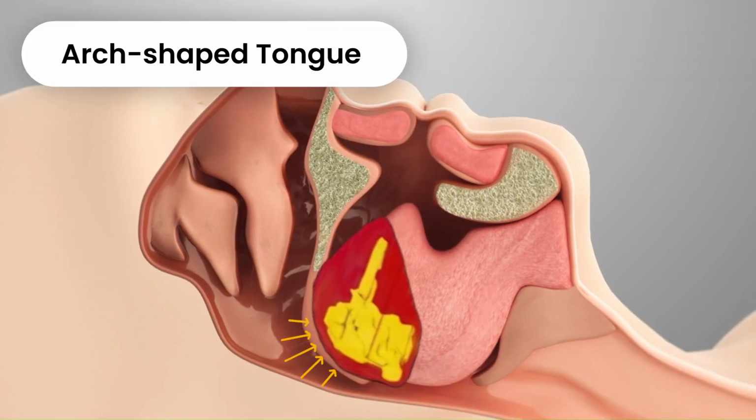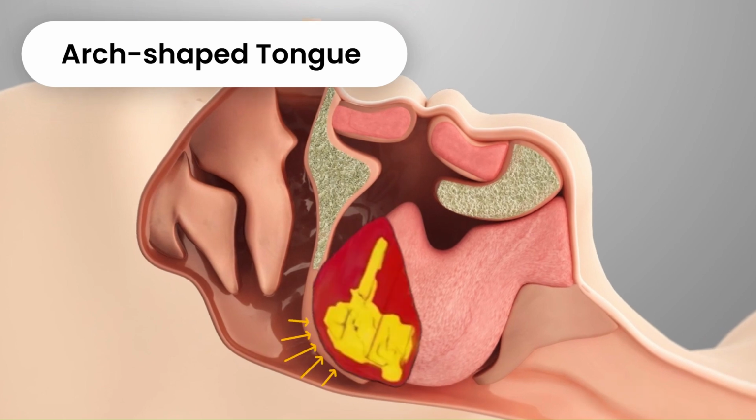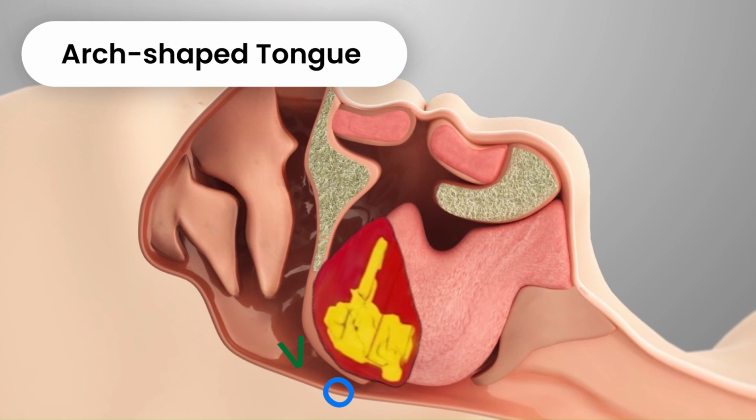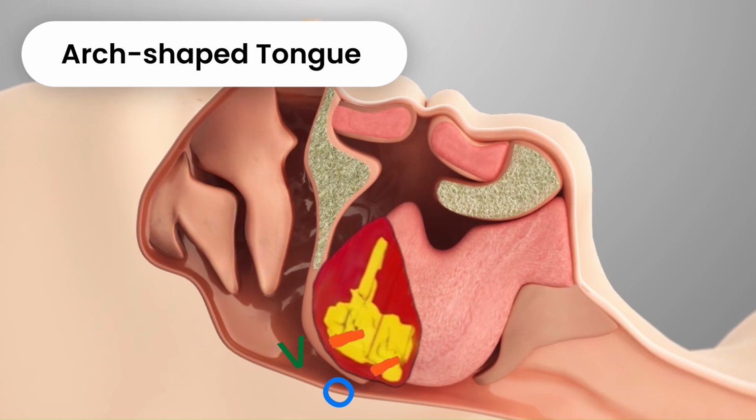An arch-shaped tongue can narrow the airway and increase resistance during sleep, which is detected using ultrasound deep tissue analysis of tongue mass and position. A deeper tongue in the velum and oropharynx, especially in those non-obese with BMI under 30, may increase OSA risk.